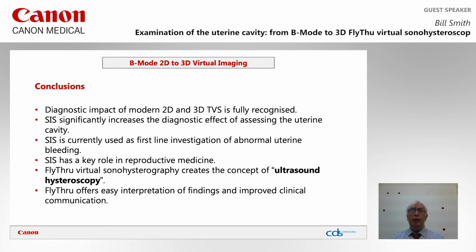And as you can see, fly-through introduces the concept of ultrasound hysteroscopy. Fly-through also is easy to interpret, and people can interpret the findings who are not familiar with ultrasound imaging. It has an important role to play in terms of improved clinical communication and pre-surgical planning.